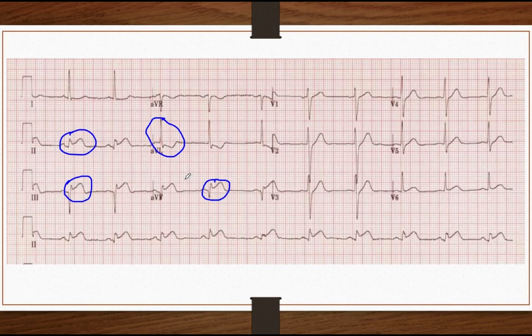Now we may also find a pathological Q in standard lead 3 as well as aVF. So we are going to find a pathological Q over here, and also over here, as you can see.